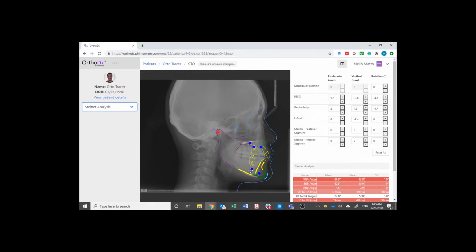segment after cutting it, and based on the final appearance, you can also take that movement back. Another feature is that you can do some auto-rotation by clicking at the purple region, which represents the whole mandible, and control it by the arrow appearing right in front of the symphysis region, just to make sure that after you do impaction of the maxilla, you can close the whole mandible.